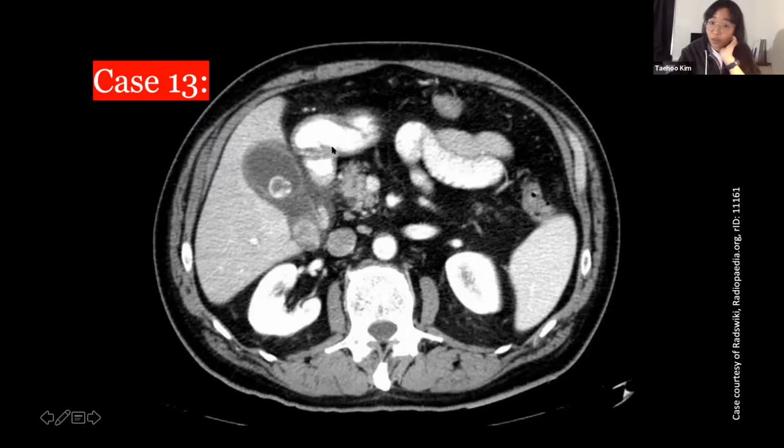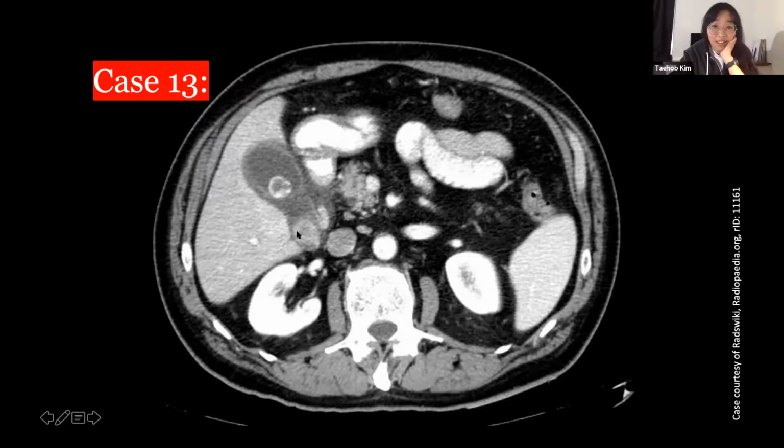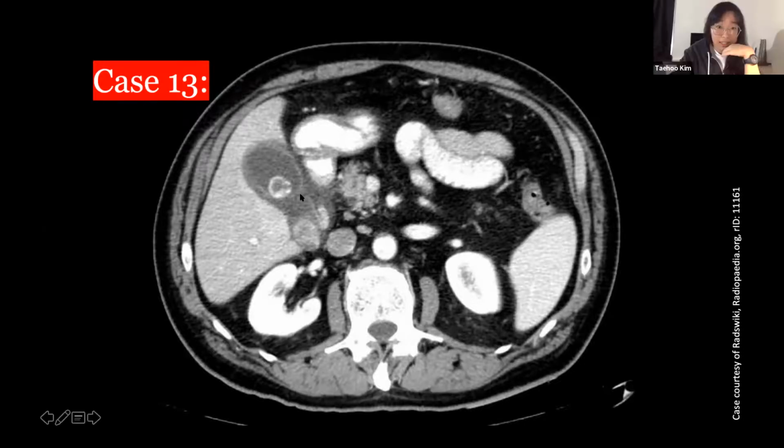So yeah, it could be duodenitis, but is there anything that catches your eye to help you? Is there a gallstone? Yeah, that's a gallstone. That's another gallstone. Those are radiodense, so we're lucky. Sometimes they're not that radiodense, so that's why after CT, sometimes you ask for ultrasound to check for gallstones. But indeed, this is a gallbladder, which looks a bit distended. The wall is enhancing. See, the wall is a bit bright. There are stones, one in the body and one near the neck of the gallbladder.